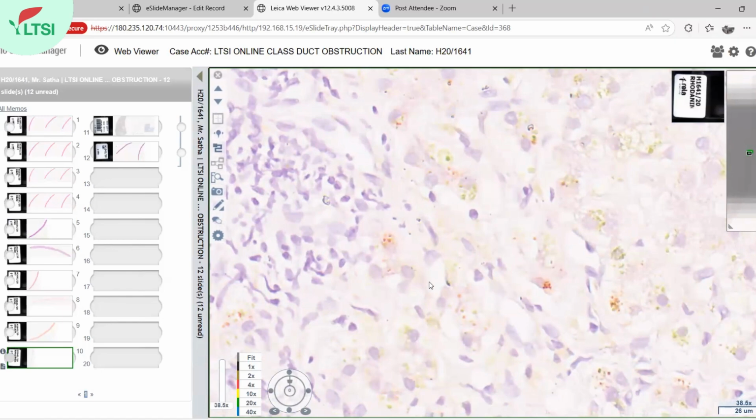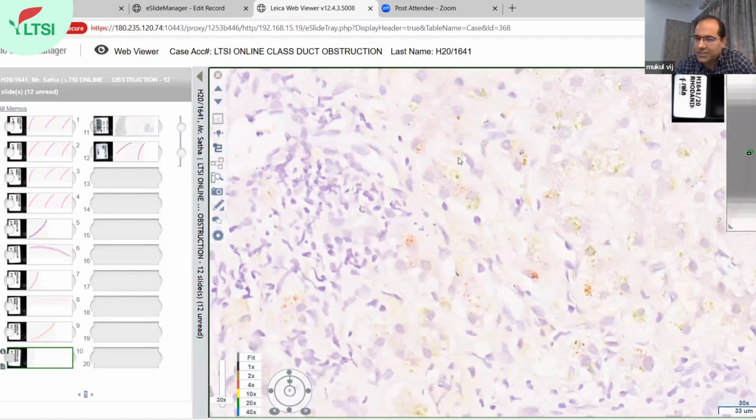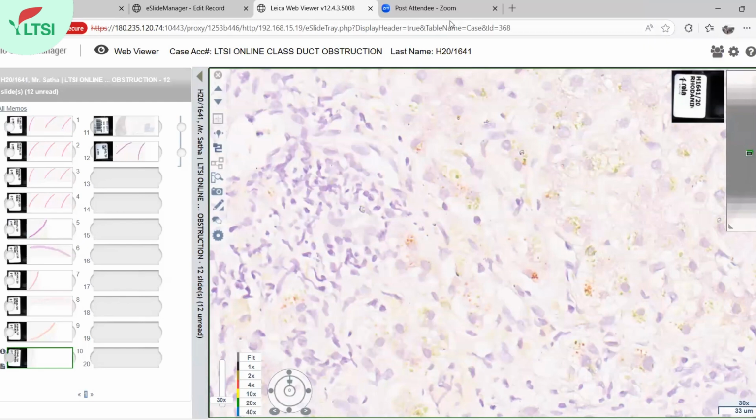Yeah, but you don't see it in Wilson's. Do you? Yes, Prof. All copper and copper associated protein, Prof. But it can be in early stages periportal, but otherwise it becomes very heterogeneous, and even in Wilson's it's very heterogeneous. It's not the same. Here most of the portal tracts in the periportal area will show copper, but Wilson's differs from nodule to nodule. So what I wanted to know here was, are there features of chronic rejection here?